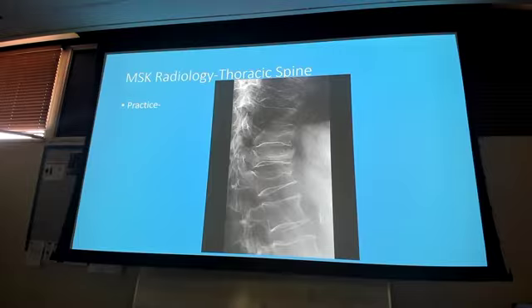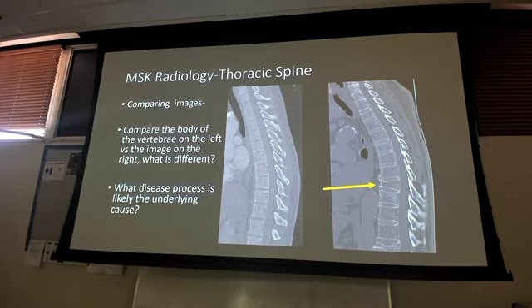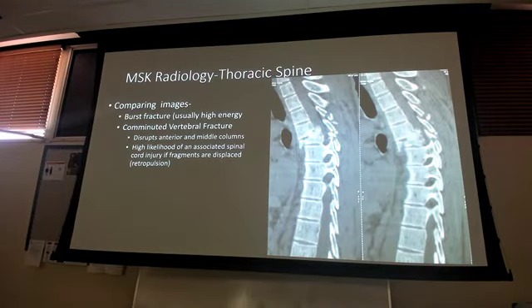So what are these? Compression fractures caused by osteoporosis. Okay. Burst fracture. Not osteoporotic, right? Another thing to look at. Look at my spine. This was my normal. Look at my CT for my osteoporosis patient. Look at my CT for my non-osteoporotic patient.